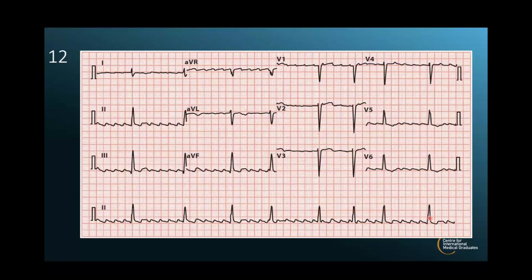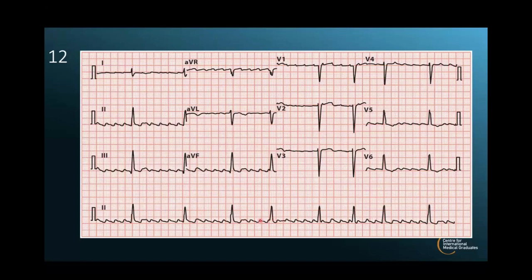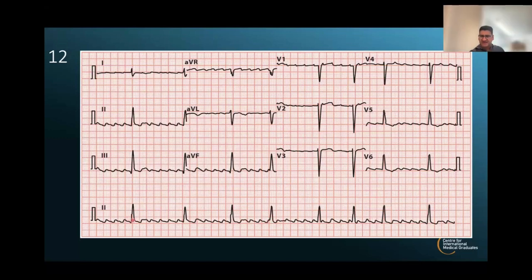So bradycardia would be an uncommon finding in that? Well, it's more the question that you've got a very irregular number of flutter waves, sawtooth waves, as you said, for each RR interval, suggesting that there is a variable AV conduction block.